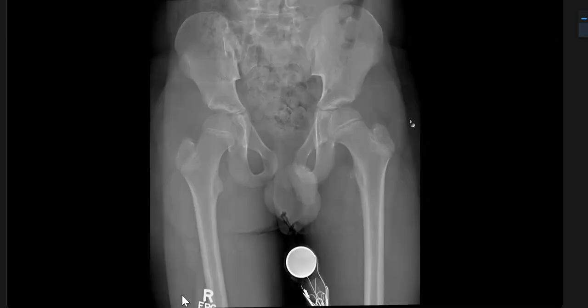And what does it mean? I would also like to observe the child to look for any shoulder deformity and any clavicular abnormality. What are you thinking? I'm thinking of cleidocranial dysostosis. And what makes you think that? There's a pubic symphysis widening, and it is associated with it. Okay, so what should we do now? I will advise a skeletal survey and a chest radiograph if available. If not, I will request it.